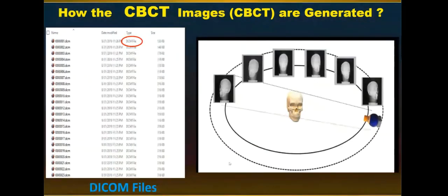So what's important about this? When you are using an implant planning software, you must import these DICOM files to the computer in order to be able to read the case and to start working on it.